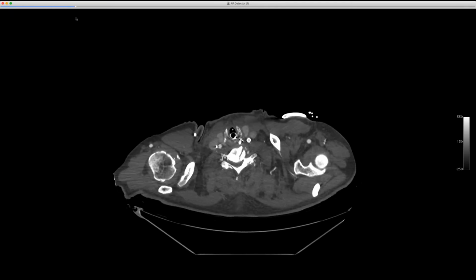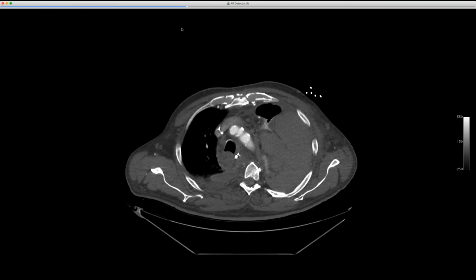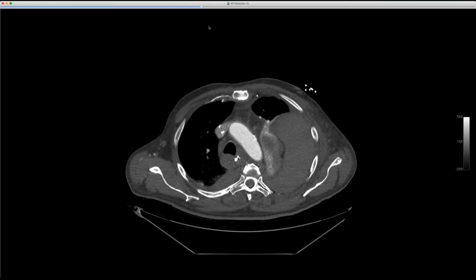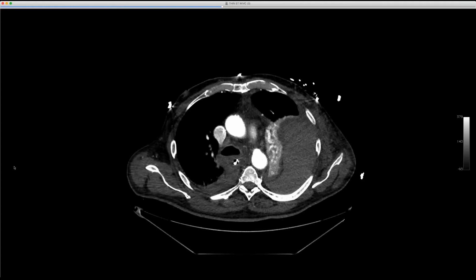At this time, nobody's done anything with his esophagus. No one has operated on it. They didn't want to touch him. Someone managed to get a gastric tube down, and you can see. Let me make sure we're seeing it here.